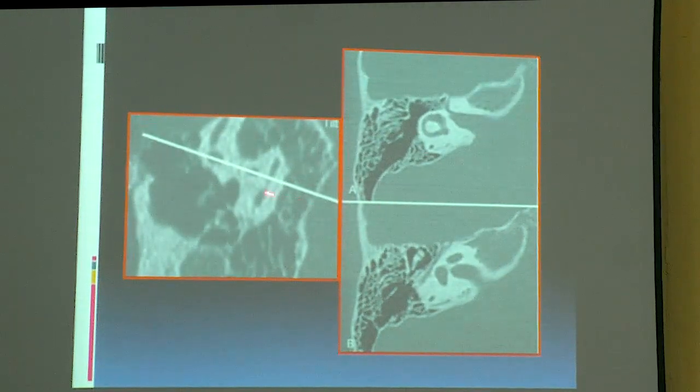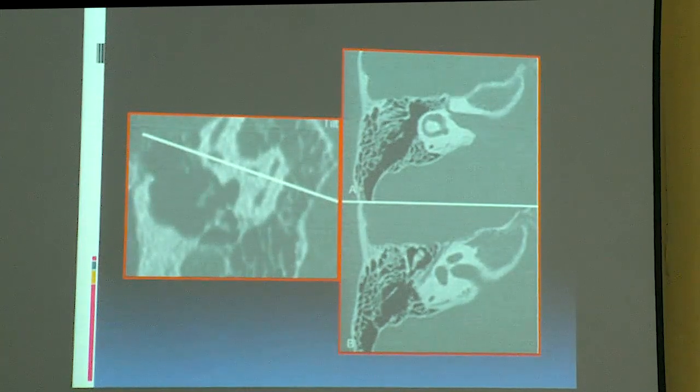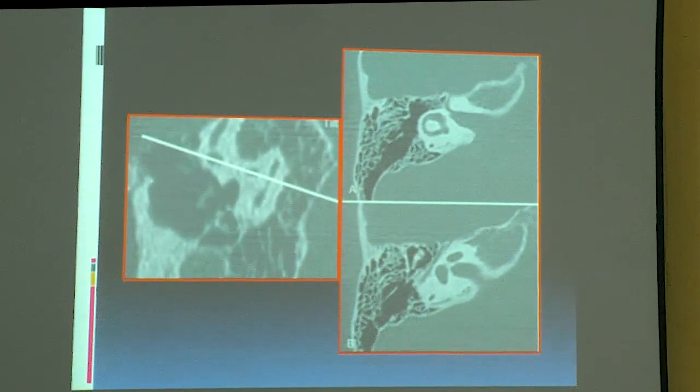I have this cut along this is the 30-degree cut along this is the ampulated end and this is the non-ampulated end of the lateral canal. So you can see if we take a cut above this, it is going to show the entire lateral canal with the vestibule, and a cut below this will show the entire tympanic segment. But we could not see it on our regular axial cut because of the 30-degree tilt of the lateral canal. Clear?